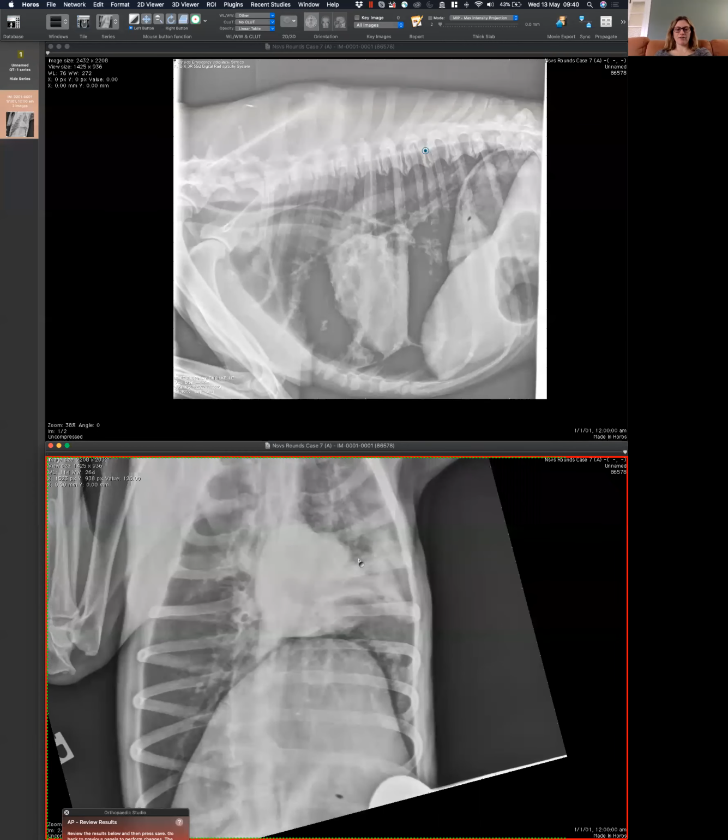And the dog was seen to have a vomit and aspiration event essentially immediately before presentation with acute respiratory distress. So in my eyes, if let's say there's a dog that vomited and you think there's aspiration in the morning, and you bring it over in the afternoon and take a radiograph and we don't see anything, I always warn that the radiographic changes lag behind. The reason is that the radiographic changes are not only due to the aspirated material, but also to the reaction of the lung to that aspirated material. And that may take a little while.